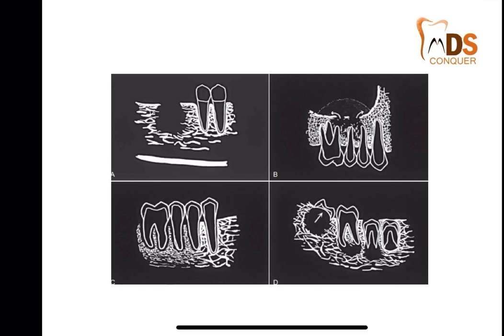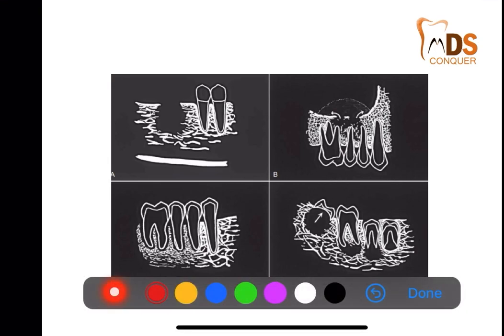Now next, coming to the malignancies. Malignancies are not that important as per the radiograph, because clinical findings play a very important role. So clinical findings have to be given, but besides that, if you see the radiograph also, you can arrive at a diagnosis. Malignancies give different types of presentation.